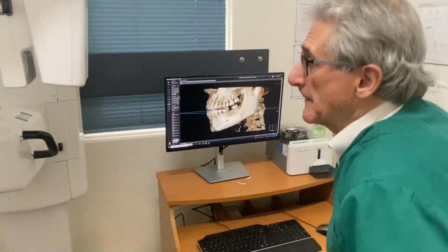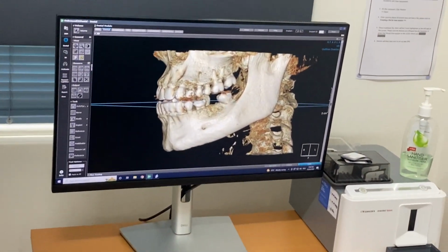Yeah, so a lady presents with a retained upper left deciduous canine, and it's mobile. She's about 30 years of age. It's about to exfoliate, and she wanted to know what are the options with implants. So very briefly, once we got her scanned, in a matter of minutes we could assess, advise and treatment plan the whole case, which we eventually did. But if you'd just like to look over here, I'll show you the 3D image of this.